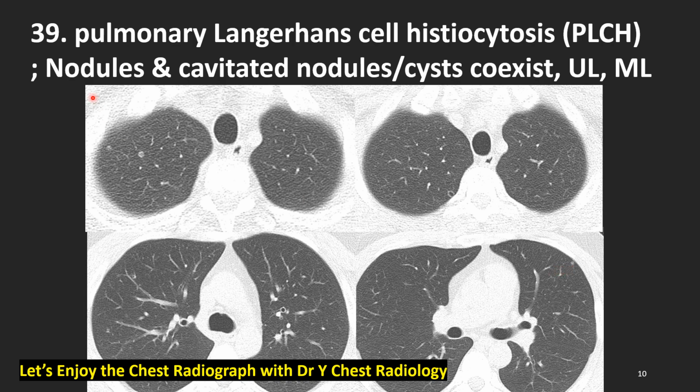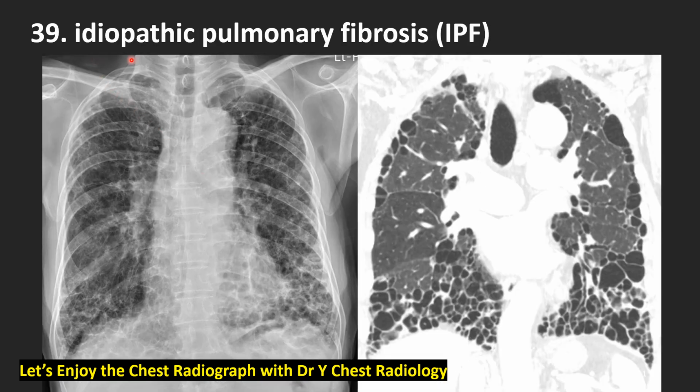Young man, heavy smoker. This is idiopathic pulmonary fibrosis, IPF. This is a coronal CT of thin section lung window setting imaging, just compared with chest radiograph. Same findings, almost same findings.